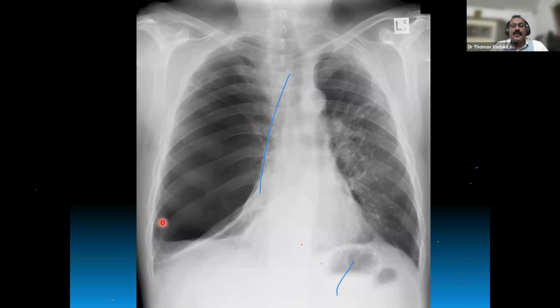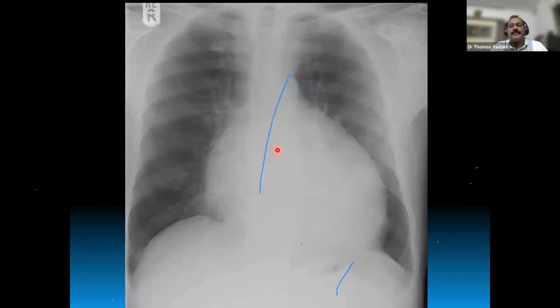Why is it tension? It causes the diaphragm to go down. It pushes the mediastinum and presses the atria towards the left side. So this is a tension bulla. So this should be either operated or you can put a small catheter to relieve the tension, which is a risky procedure, but always a surgery would be a better choice if patient is symptomatic.